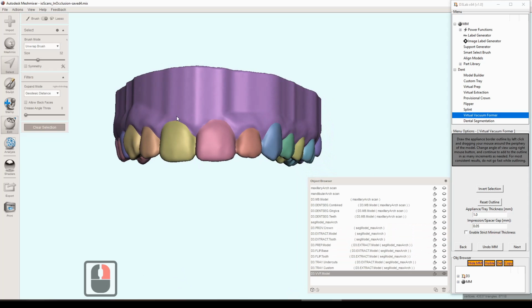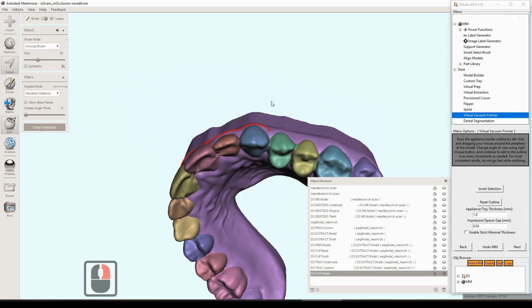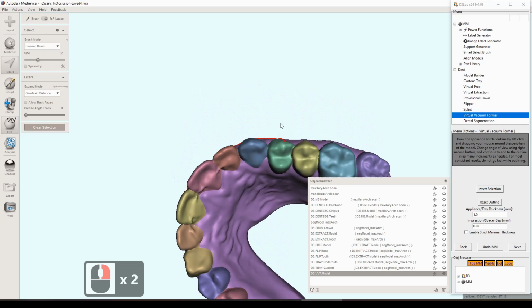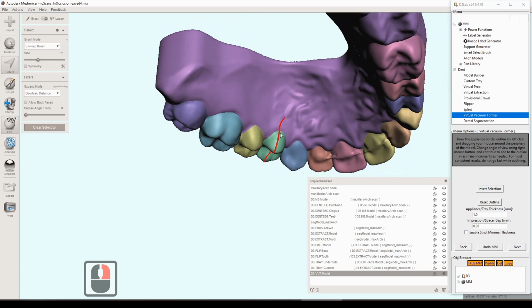Before, even though this is a segmented model, we've done tricks to easily select teeth and things like that. In this particular example, it's actually better to use this drawing tool. The reason is because we're not just selecting either the gums or the teeth, but a combination of both. As you can see right here, we're going directly through the center of this tooth. And it really helps to just draw with this tool instead of using the segmentation tricks we were doing earlier.